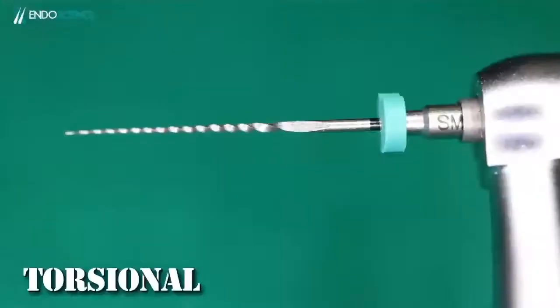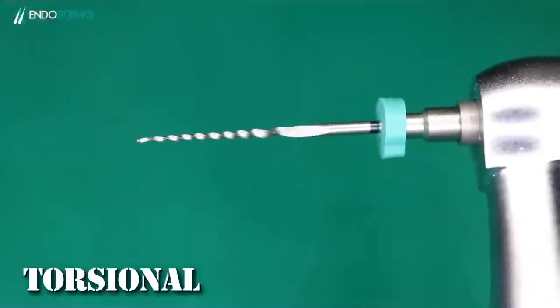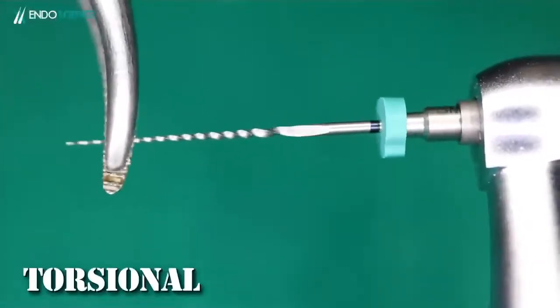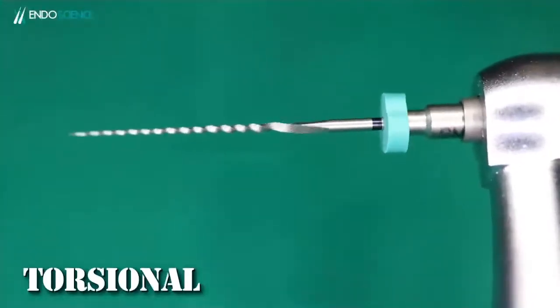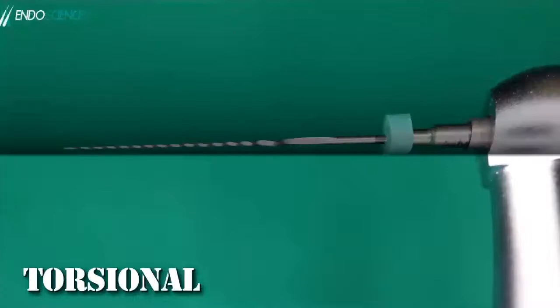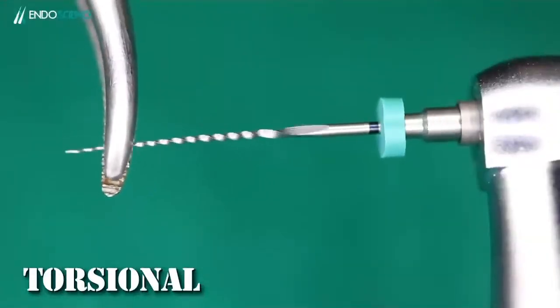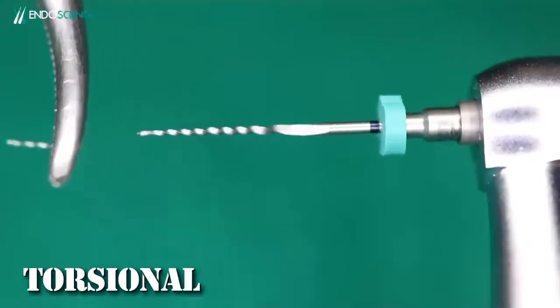The second fracture is associated with immobilization of the tip of the file. So when we have this immobilization, the tip is locked somewhere in the root canal. It's still in rotation and will deform and fracture. We can see it in slow motion. It's easy to understand, to see. So the file starts, when it's locked, to deform until it breaks, and it's a big problem for us.